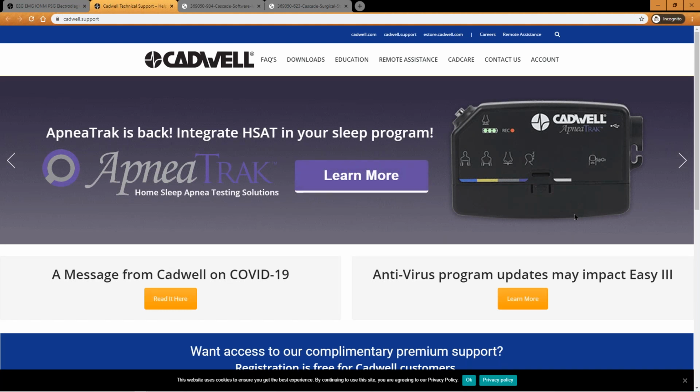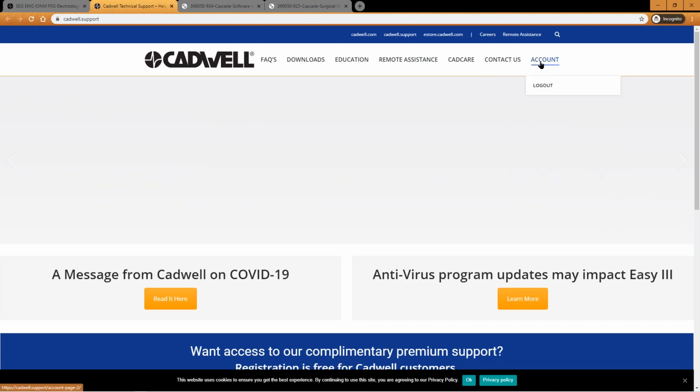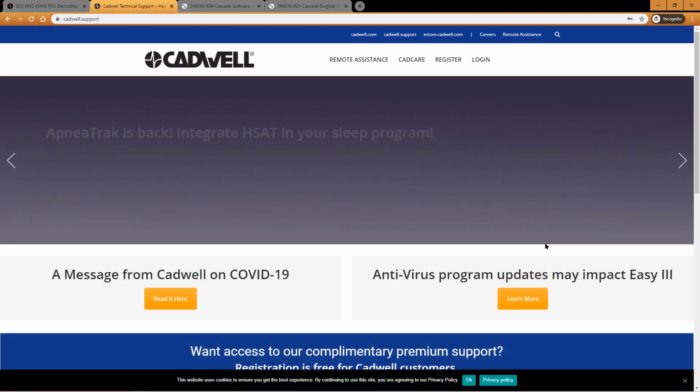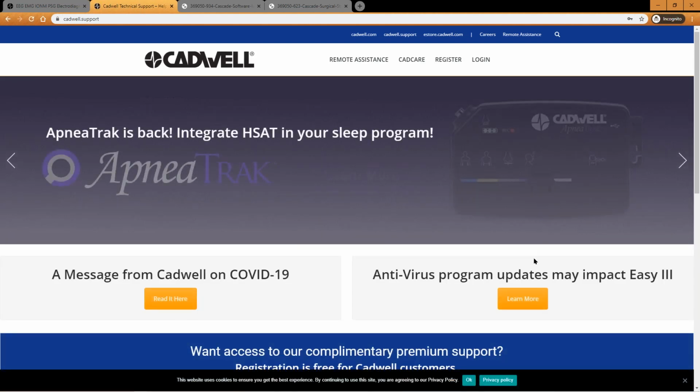You'll then be launched on our Cadwell Support website, and you will need to sign in. I'm actually signed in already, so I'm going to log out. So this would be the screen that you would see.